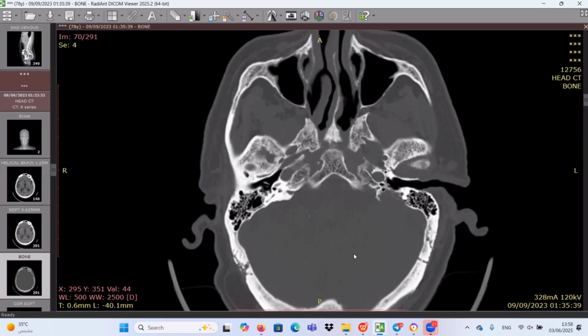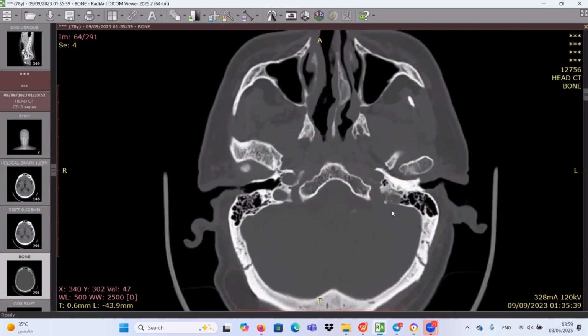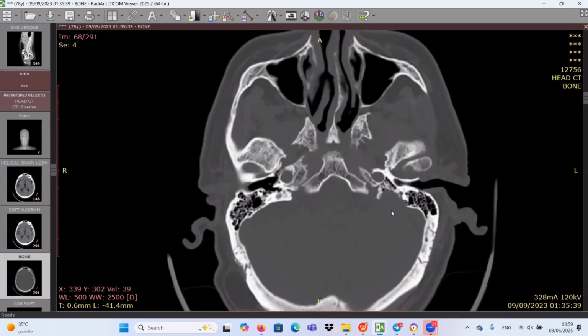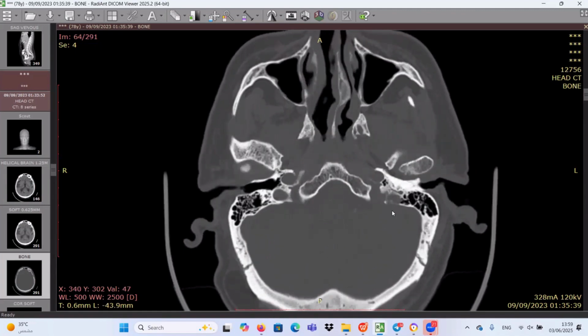My differential would be... Sorry, doctor, I'm not so sure what I can say. Can I help you, please? To conclude, what did you say? I think you described the mass lesion in the soft tissue window very well. I would like to add some important tips here.